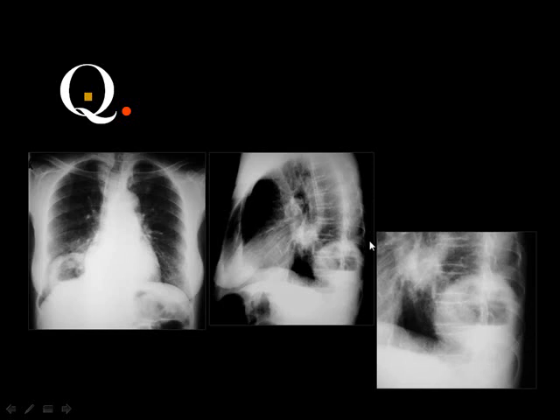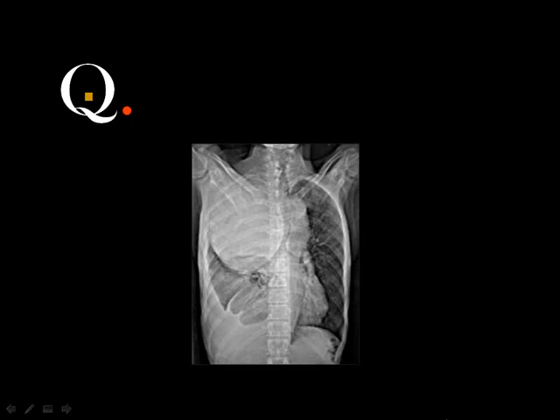But this wall of the lesion, is it thick or thin? Thick. And what about the inner margin? Is it regular or irregular? Then, in the breakdown of a neoplasm, you may get a fluid level, which represents the necrotic material inside the lesion, and you may get a ball, and you may get both a ball and a fluid level. The most important of this, I emphasize once more, is the thickness of the wall and the irregularity of the inner margin. Don't look to the air fluid level or the mass inside the cavity. This is a cavitating bronchogenic carcinoma.